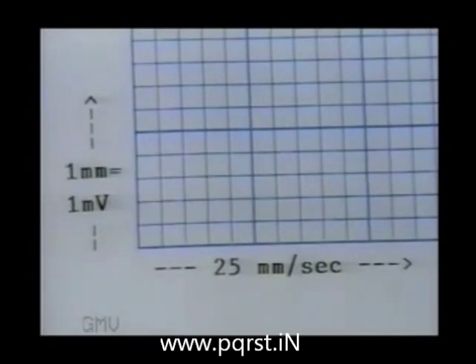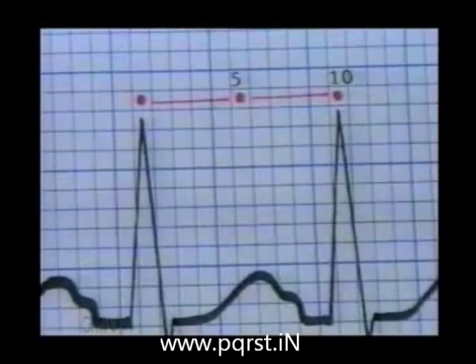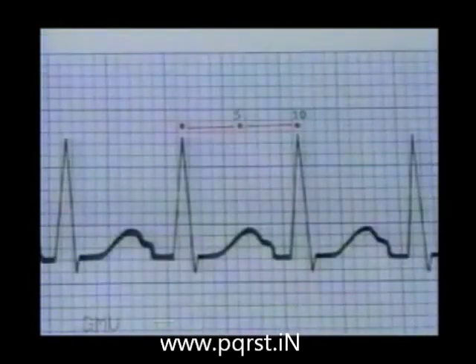So each small square represents 0.04 seconds, and each large square represents 0.2 seconds, and 1500 small squares represent 1 minute. In this ECG, the RR interval measures 10 small squares. So the rate is 1500 divided by 10 equal to 150 per minute.